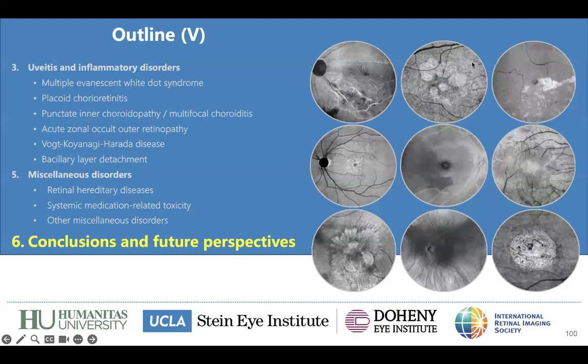Thanks so much, Ricardo. Yes, this is a very important point. I think this is an alternative way to look at en face OCT images. I think their applications are very important in this field as well. You were mentioning also the possibility to use heat maps, and I think this is very useful, not only as I showed you, for example, in the context of pachychoroid disease, where we can correlate the thickness map of the choroid with hyperpermeability, but also, more simply, in the context of AMD, where we can use these heat maps to detect the drusen volume, which is a very important biomarker of progression from intermediate to late AMD.